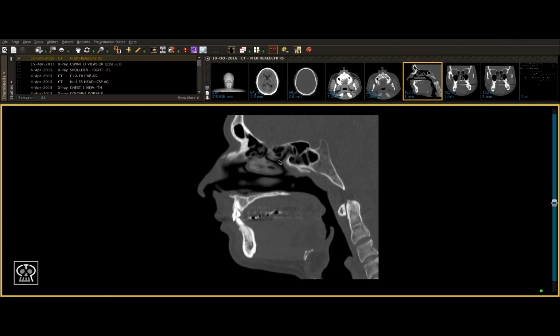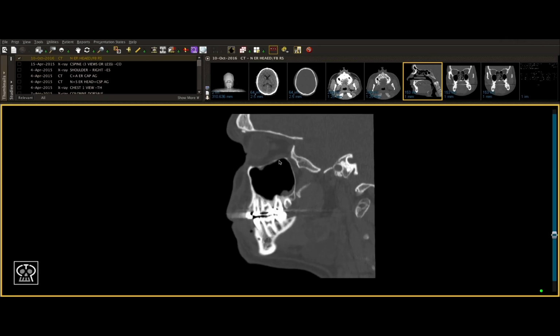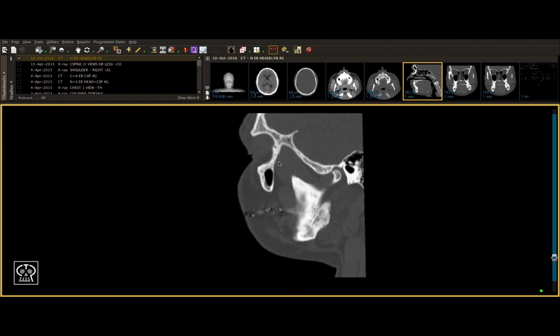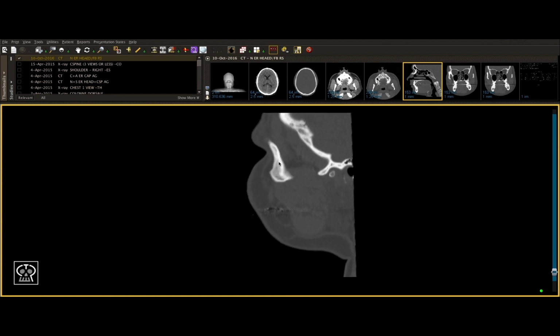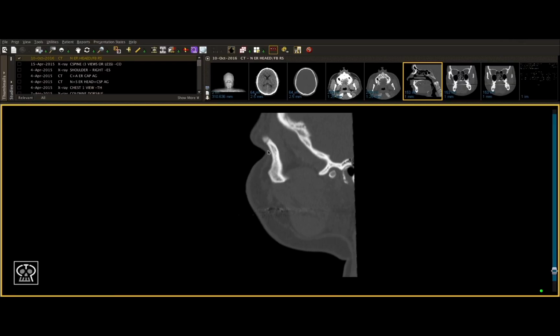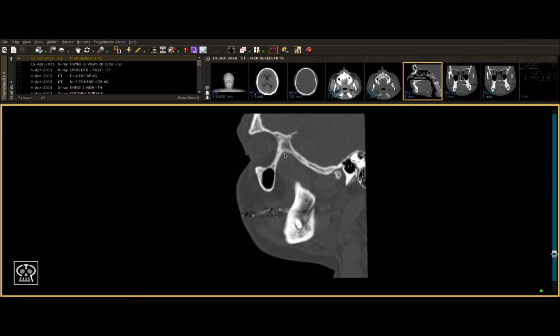After examining one side, you'll scroll over across to the other side and look at the same things. Once again, making sure to scroll all the way through to look for any potential fractures. And making sure not to get confused by your ZF suture as we discussed before, or internally in the orbit, your ZS suture, which can also look a little bit like a fracture line here.